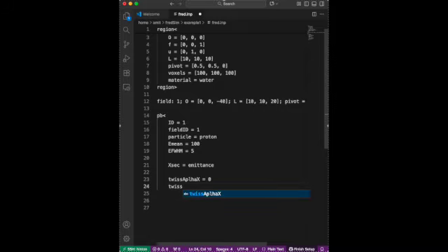Twiss beta, I'm taking this value from, we can have any value, and the radius, it doesn't matter because it's going to be a beam spot of zero size. I mean, without any spot, because I'll put the value of emittance as zero, which will make the entire beam a pencil beam, just a straight beam.